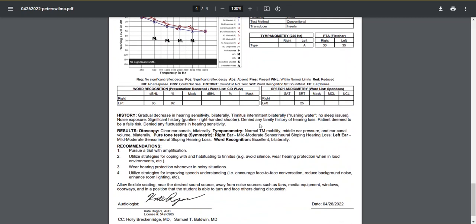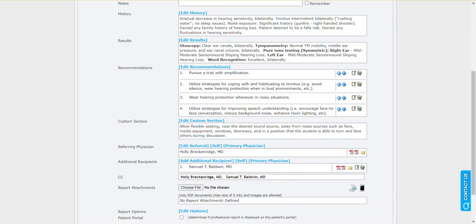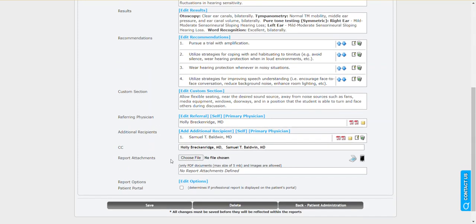But the idea overall is to get you to this point as quickly and as accurately as possible. Okay, so taking you all from Counselor Insight, collecting the case history, to collecting test results, to updating the history, results, recommendations, recipients, etc. We want you to get this done as quickly as possible. Okay, if you look at this and decide, oh, that's not what I need, I need to make some modifications here, you absolutely can, right? First off, you can add attachments.